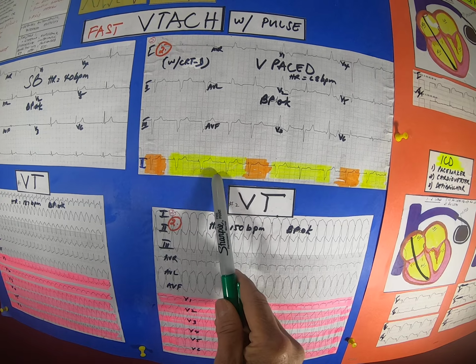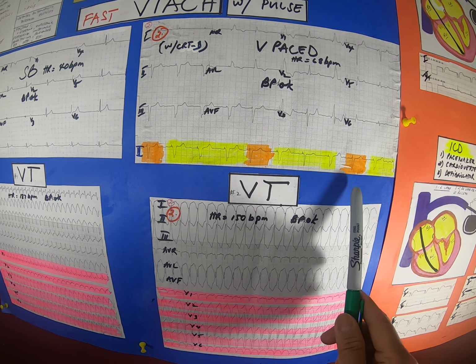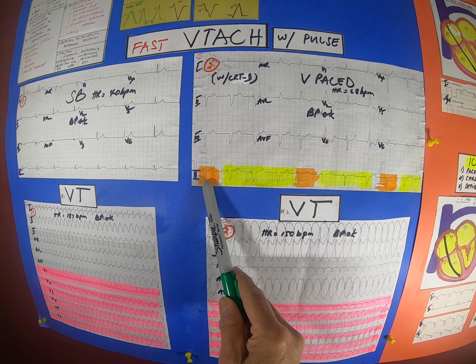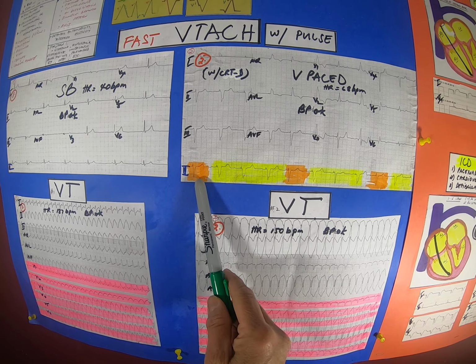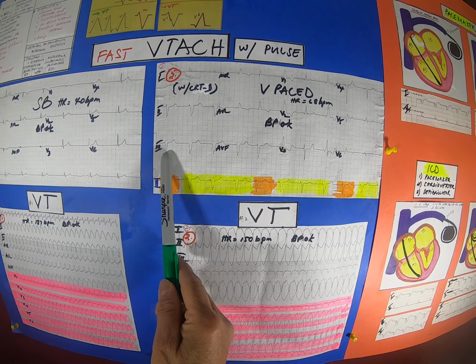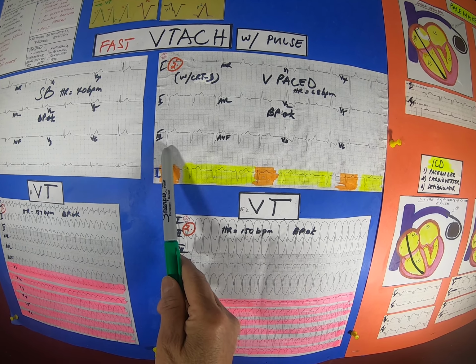It depends. Okay, because with CRTD, we are biventricularly pacing the patient, which is a cardiac resynchronization therapy, which is an anti-failure regimen. Okay, looking at these inherent QRSs in here, I suspect the patient might have a left anterior fascicular block, which you see on lead 1 and 3. Lead 1, we might have a Q, and lead 3, we have an S. So there is a possible left anterior fascicular block, which is also an incomplete left bundle branch block.